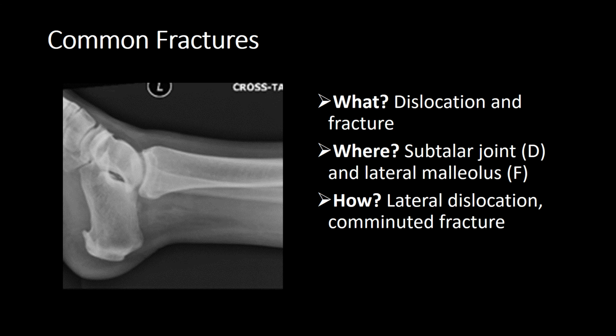So what is it? It's a dislocation and fracture, with subtalar joint dislocation and lateral malleolus fracture. How? Lateral dislocation and a comminuted fracture.